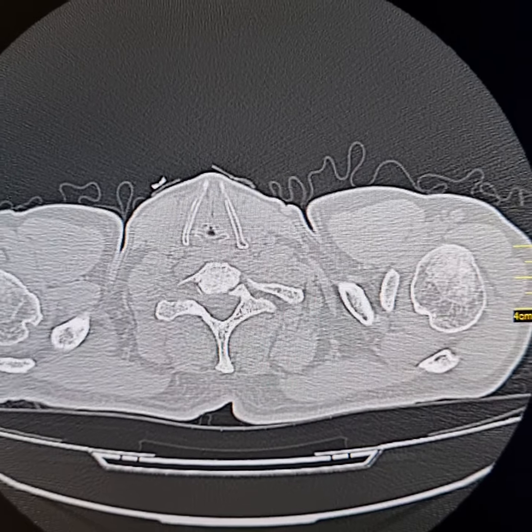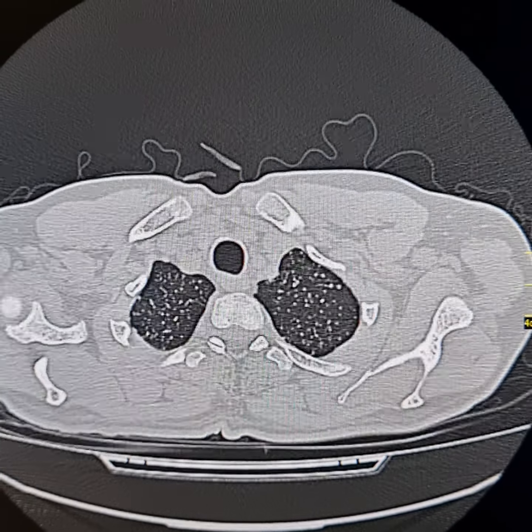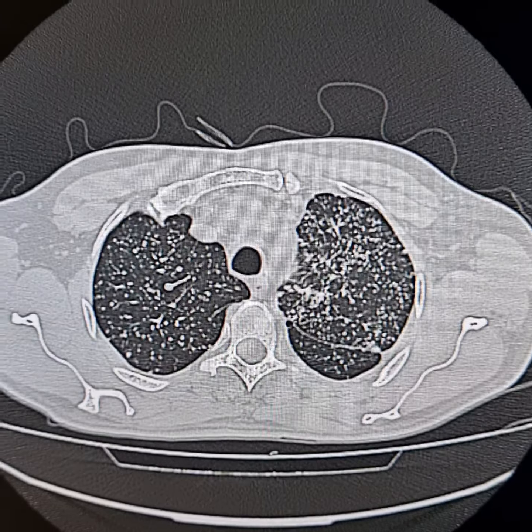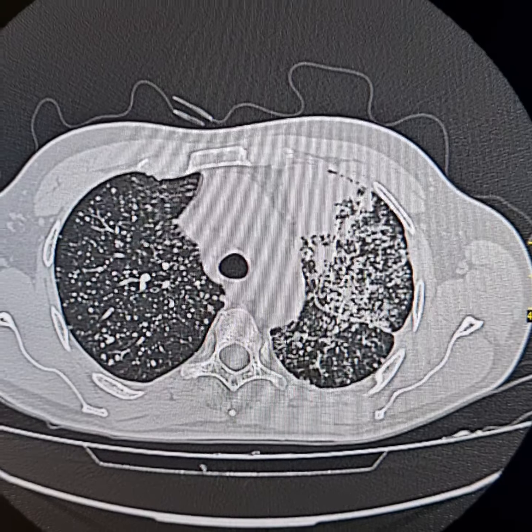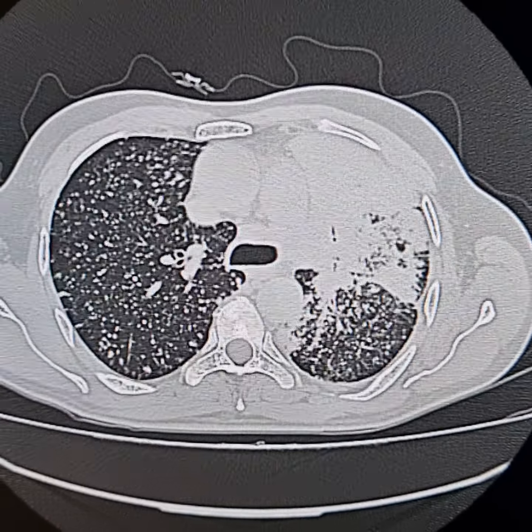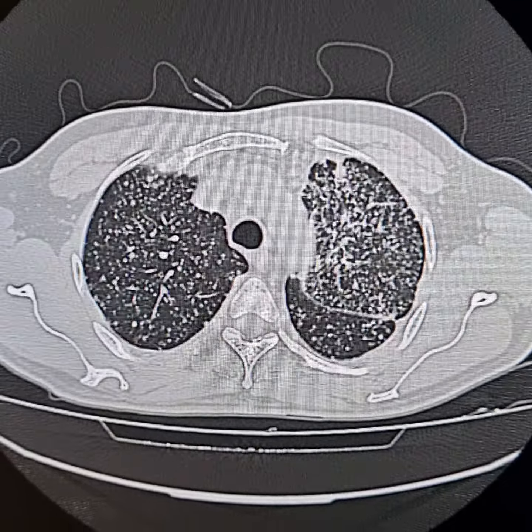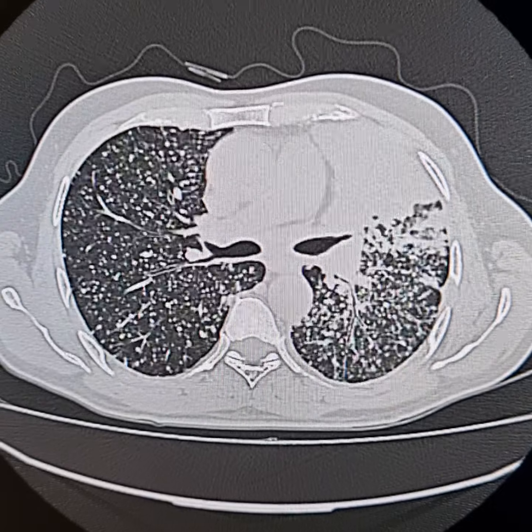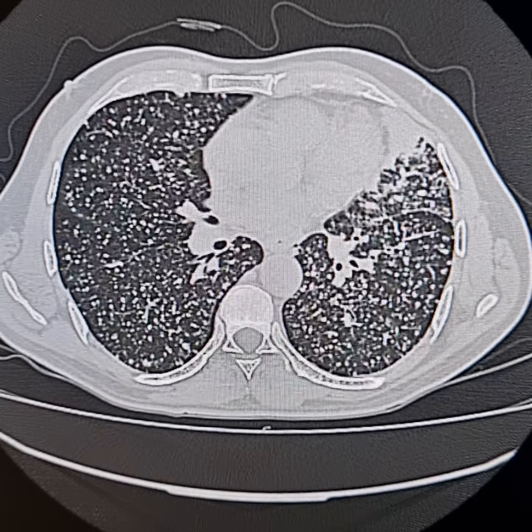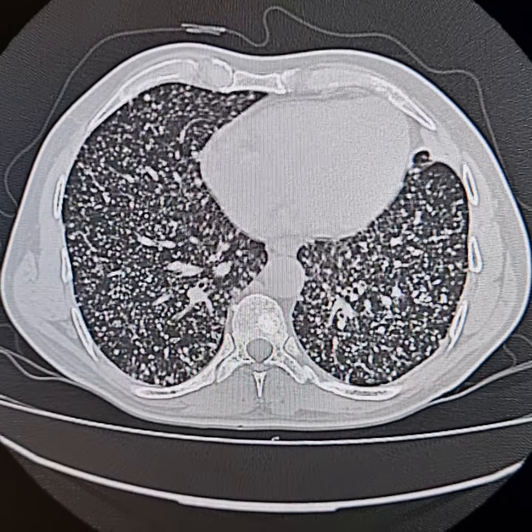This is an HRCT of a 63 year old male patient who presented with weight loss and mild productive cough. There is no history of fever. You can see the tiny nodular shadows infiltrating both the lungs. These are relatively more abundant in the left upper lobe. Low down, both the lungs are almost evenly involved.